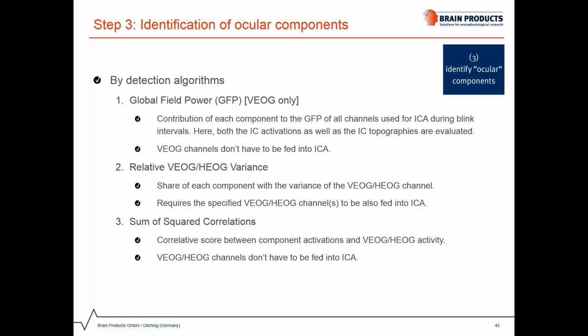And the last one is based on correlation between component activation and VEOG and HEOG activity. So generally, these will all check a component with respect to the channels that you have selected for VEOG and HEOG.